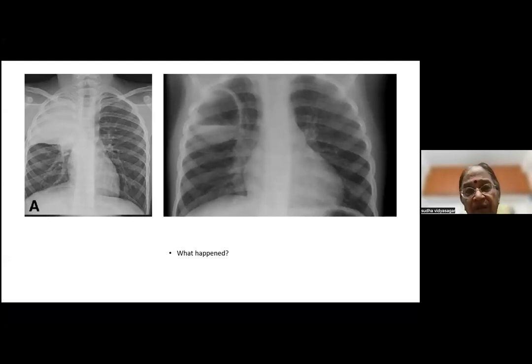The consolidation can go on to a lung abscess, can spread to the pleura, can become an empyema, pneumonic effusion, and then it will go this side, pericarditis, myocarditis this side, and then it can spread outside and go wherever it wants and cause a septic shock, right? So this is a consolidation which is becoming a lung abscess.